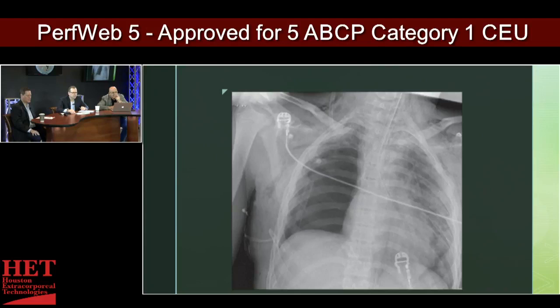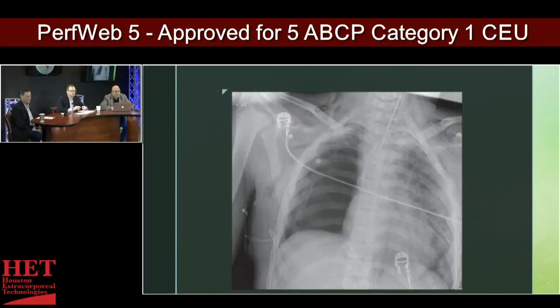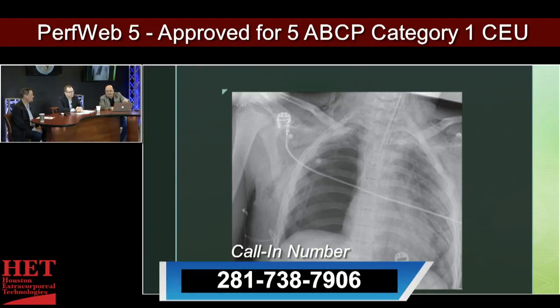This one's slightly different. This is a little stump here. So, let's see if anybody's going to ask on here. I'll put it on the chat. What do you think? So anybody at home dialing in? Roger, hey, you want to send a message out, open the phone lines? Let's see if anybody wants to call in and guess at what the problem is with this last x-ray. It'll take about 20 seconds or so, and I'm watching it here, so I'll know when the people at home actually see the message.